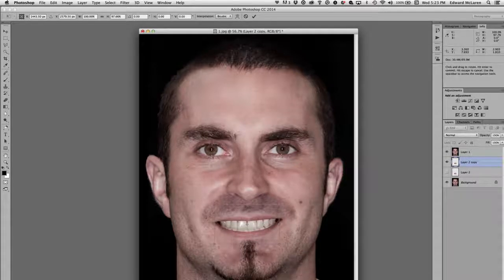How does that sound to you? That's easier for you occlusally to do something like that. Great. Okay. Maybe that's a little bit better than what he started with. So there's the new teeth, old teeth, new teeth, old teeth, new teeth, old teeth. And then we'll talk about digital measuring in another chapter.